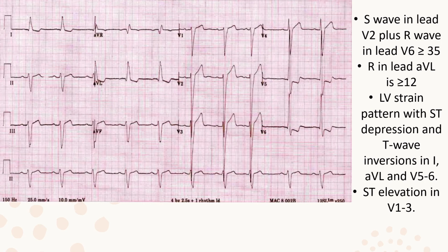And they have hypertrophy. So this is a big old heart, isn't it? It is a big old mess of a heart. And they have left ventricular hypertrophy. So that's how we basically evaluate an EKG. We start off by doing our rate, our rhythm, our intervals. We look for axis. We do bundle branch evaluation, and then we look for hypertrophy. Now, so we have left ventricular hypertrophy. Do we have any atrial hypertrophy?